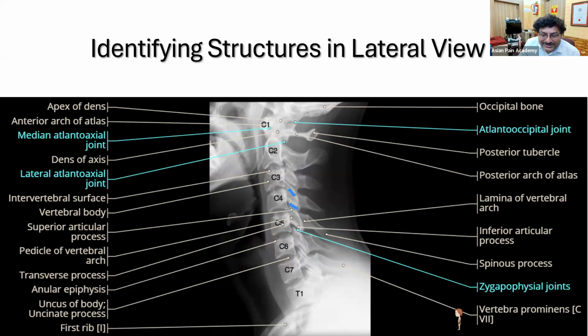So where is the transverse process? So transverse process we see actually end on, and we can see some shadow here at this point within the vertebral body here, here, okay, similarly here. So I think we can see these are the end-on views of the transverse process.